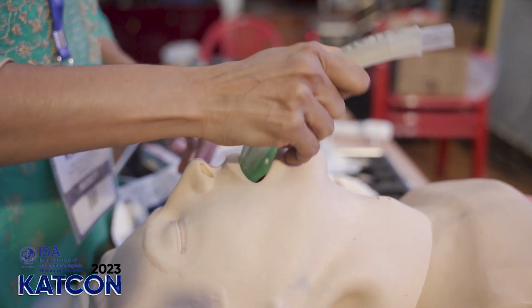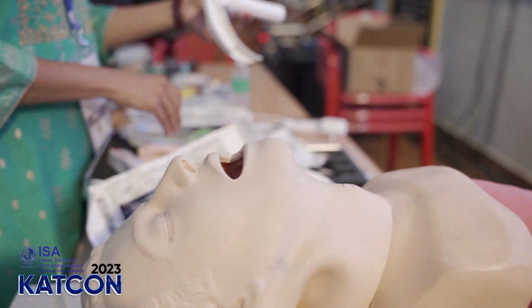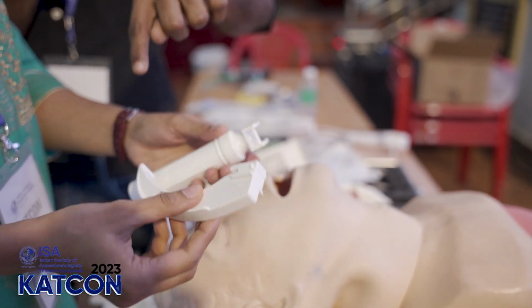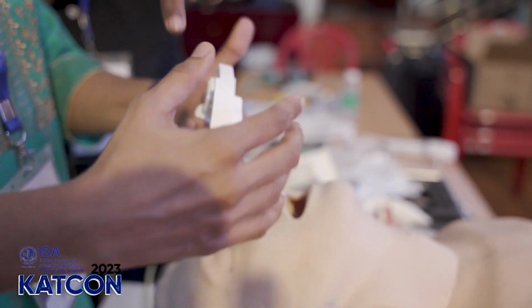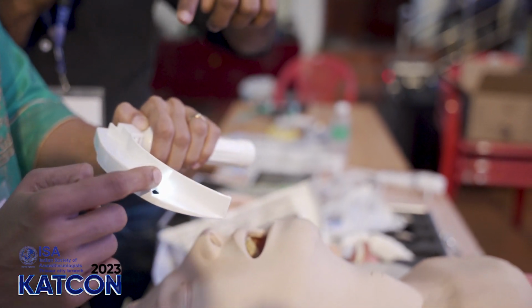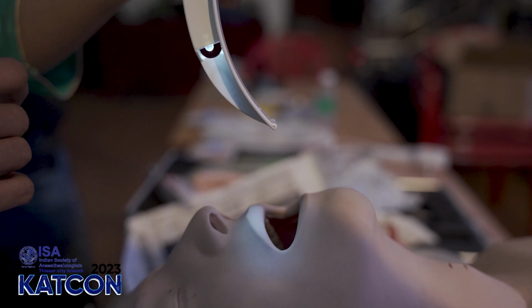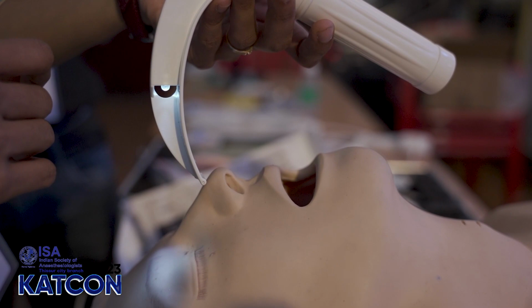Next one is a video laryngoscope. Before the video laryngoscope, we forgot about one thing actually. This is our main instrument, that is a Macintosh laryngoscope. That is the laryngoscope with the Macintosh handle. So you have a handle and the blade. The blade contains the light source. This is the commonly used Macintosh blade. Actually, different sizes are available. The anesthetist will tell you which size blade to be used.